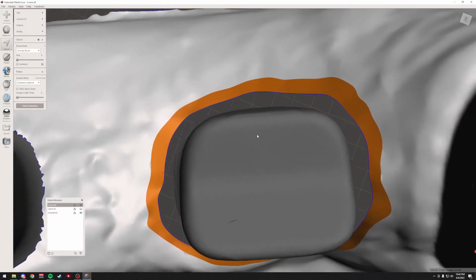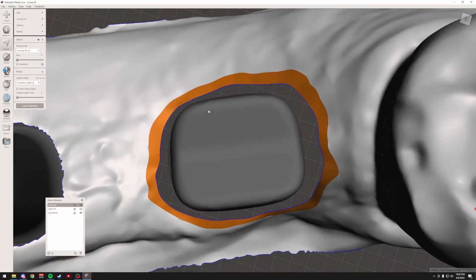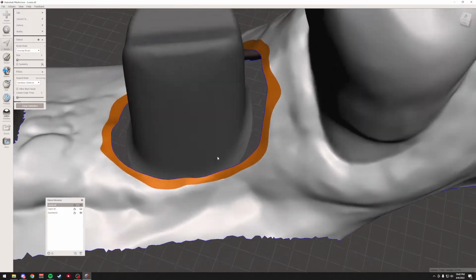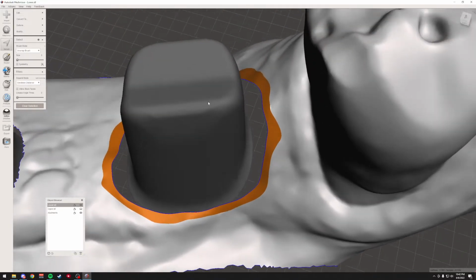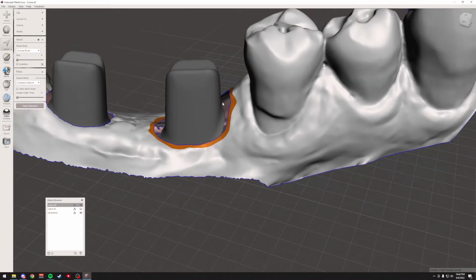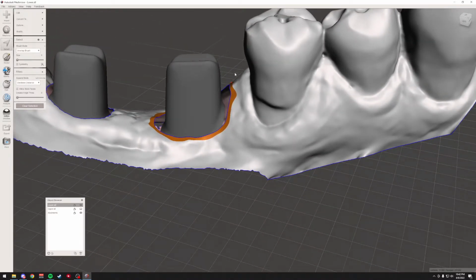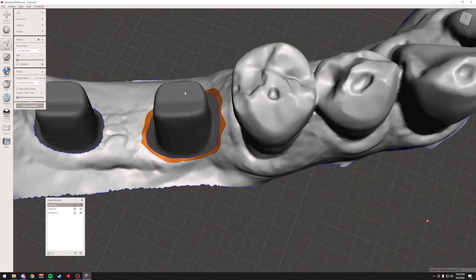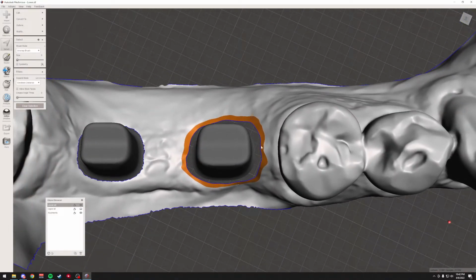Okay. So now I've got space between the abutment and this simulated tissue here to where I could probably get a crown in there to try it in and check the contacts. Let's say you know that this crown coming out of this deeper area has got to come up here and touch this contact. If you're worried that this is going to get in the way, you can always trim it outside the mouth, or you can just make that ring bigger. But for what we're doing here, we want this area selected here.